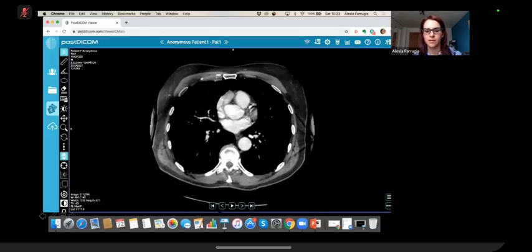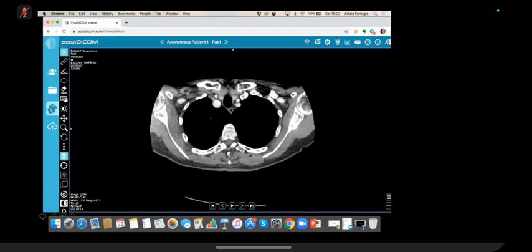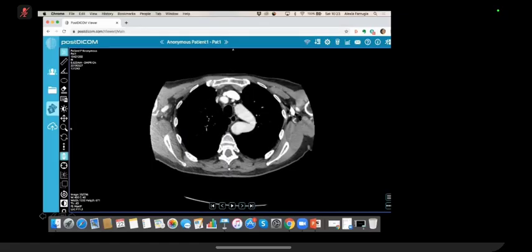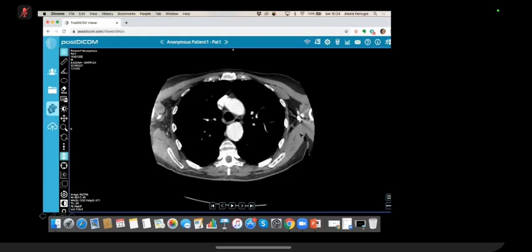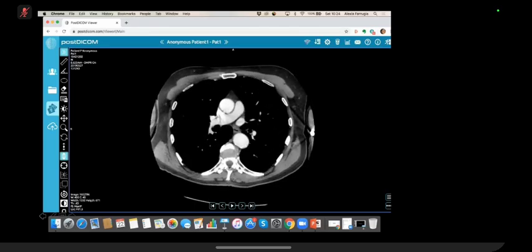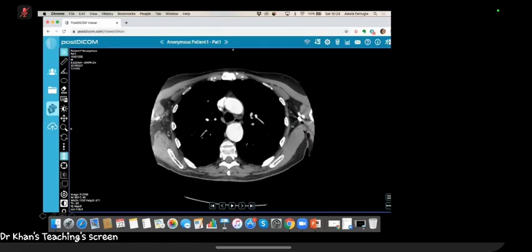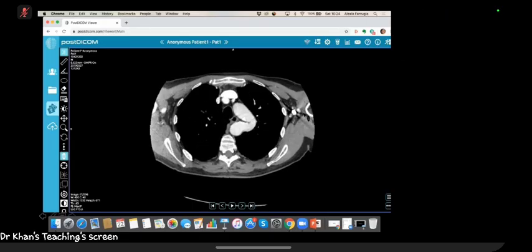Okay. So let's go through that again. Okay, so it's a CT thorax in arterial phase. And corresponding to the mass-like structure that I saw on the chest X-ray, the aorta appears to have a slightly ectatic appearance. Specifically, which part? It's next to the aortic arch around here.